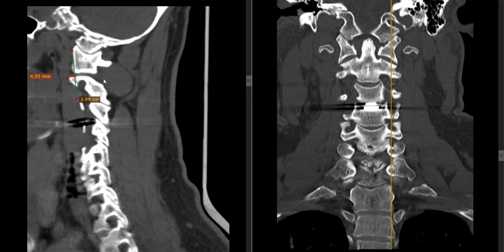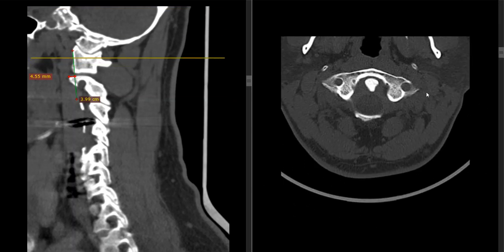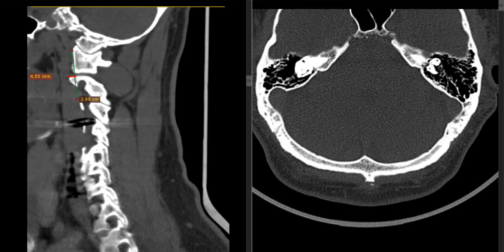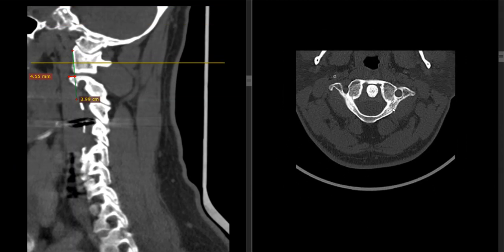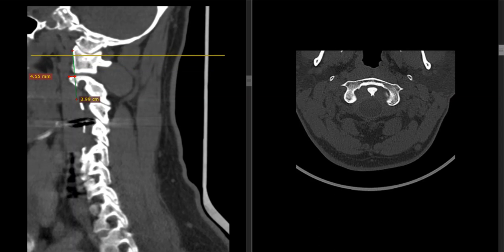So this is likely a rotation. So how we're going to find out, we're going to come over here and zoom out. Of course, they chop the head off. I can't do this. That's what drives me nuts. Let me see, did they chop it all? Yes, they did. Go figure. They cut the face off because I like to try to find out exactly where center is.